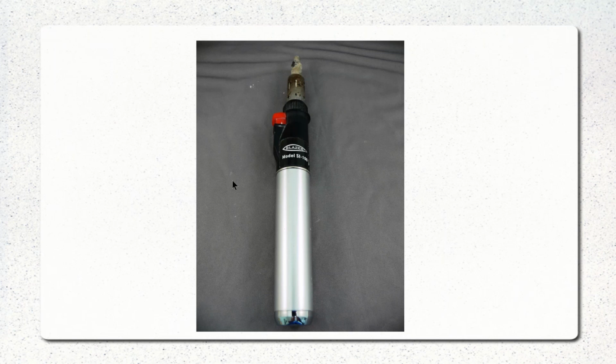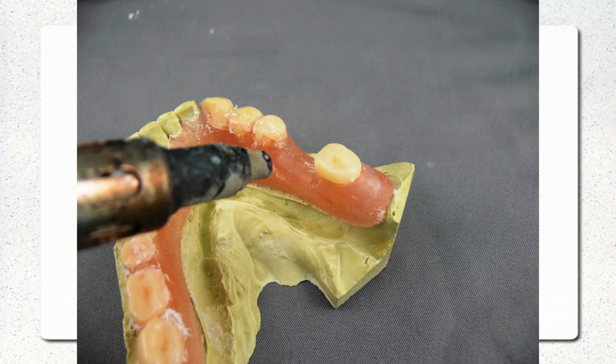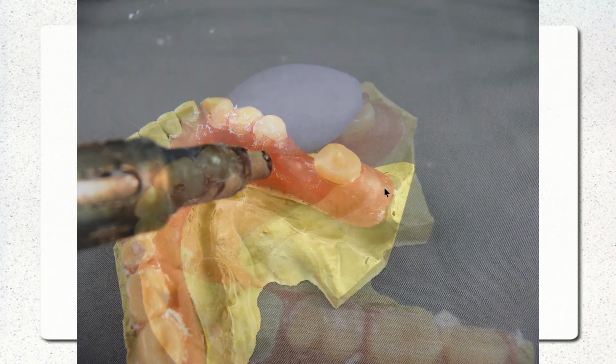And so you'll have the Hotshot gun ready, essentially loaded with the material and it's melted. You'll then take your torch and hit that area, getting the nozzle of the torch as close as you can for about 2 seconds. Then you'll bring the gun over, inject a blob in that space, pick up your putty, and smash it into place like you were doing an acrylic repair at that point.